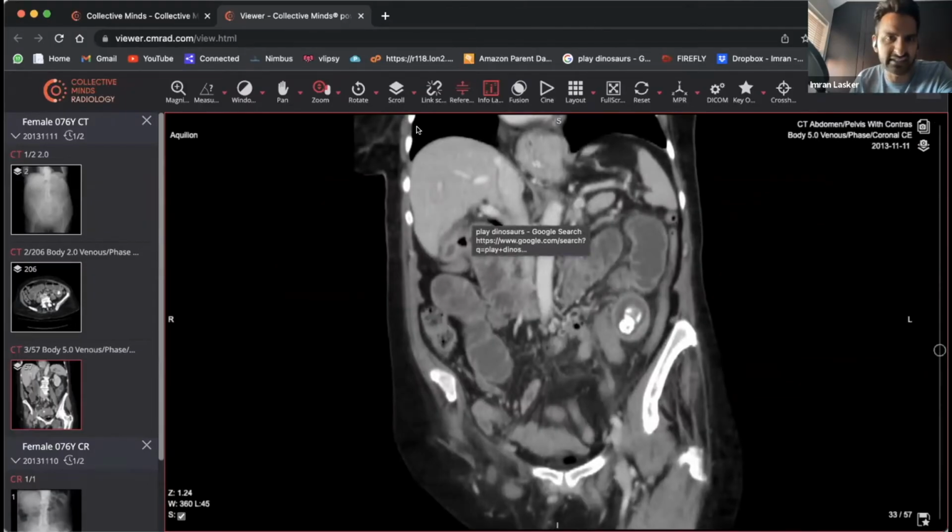So someone said it exactly right. Yeah, well done. And you've also spotted the height earlier. Well done. So yeah, this is exactly. So someone has said what it is, and what it is a gallstone ileus. This is a gallstone ileus.